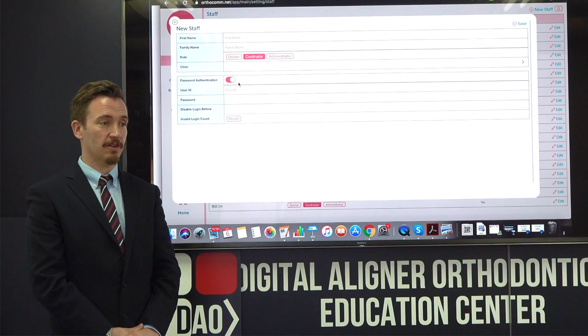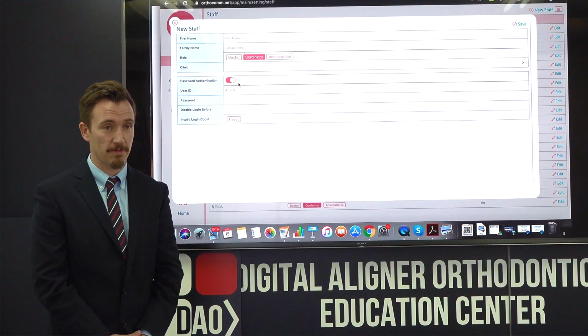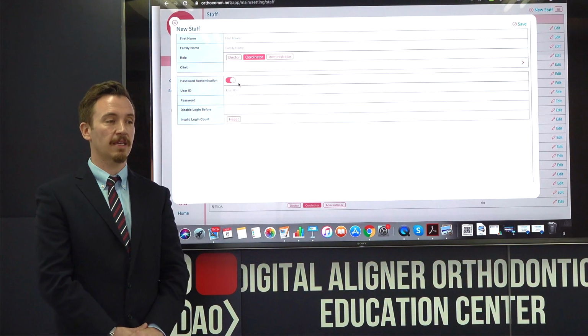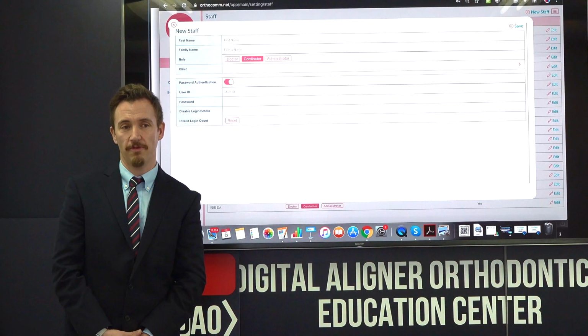As much as we'd like our teams to stay together forever, the unfortunate reality is that people come and go. The ability to remove someone from the system, to remove their access to your patient data, is critical for maintaining the integrity of your patient data. So for each member of your team, you would want to create their own unique profile.